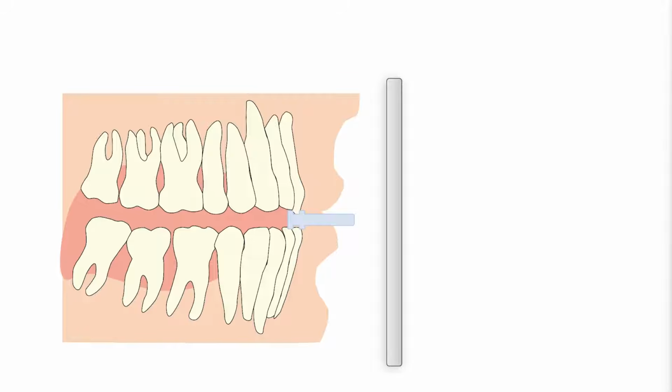In Unit 2, we are going to review the tongue position error, the most common error. Our literature review has shown that 70 to 80% of panoramic radiographs have tongue positioning error. Ideally, we want the dorsum of the tongue touching the hard palate. Sometimes the patient cannot follow our instruction and does not put the tongue on the roof of the mouth. Sometimes during exposure, the patient becomes tired and drops the tongue.